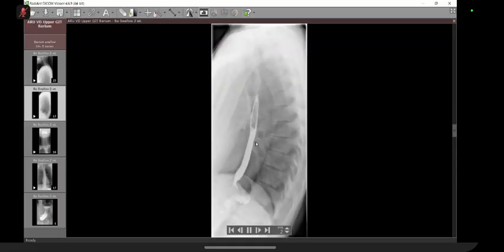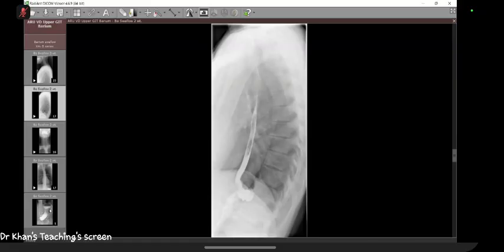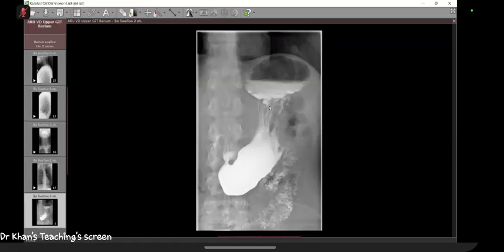So this is how it looks on lateral, and ultimately we do films of this. When we do a barium swallow, we make the patient supine. We change to a bit of an oblique position and give the patient a bit of water to drink on the table. The idea is to look for any reflux. So we can at times diagnose reflux like that.